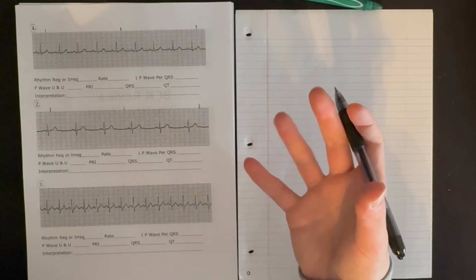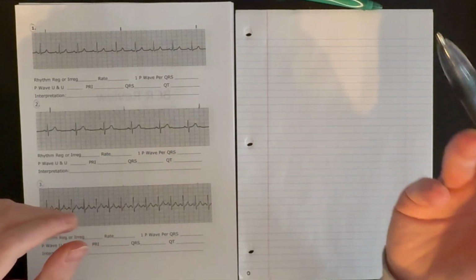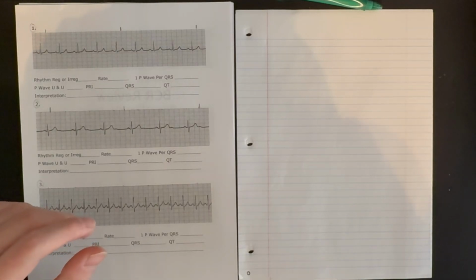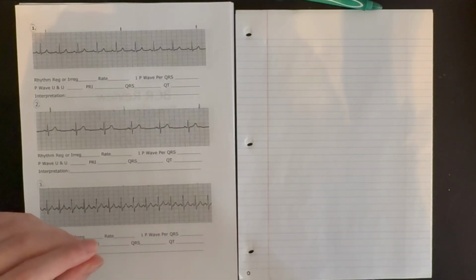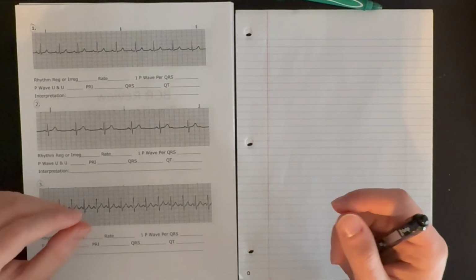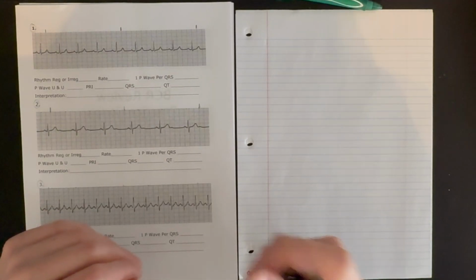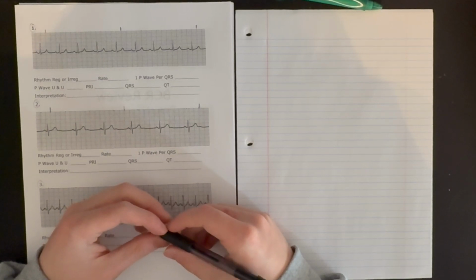Remember, because it gives us a very good viewing angle of the electrical activity in the heart. Looking from the bottom left, so through the apex, through the center of the heart, up to the top right of the atria. And so what we really see is that atrial contraction very well in lead 2, which is so important. We then went through our systematic approach to reading that telemetry strip, our 5 steps.